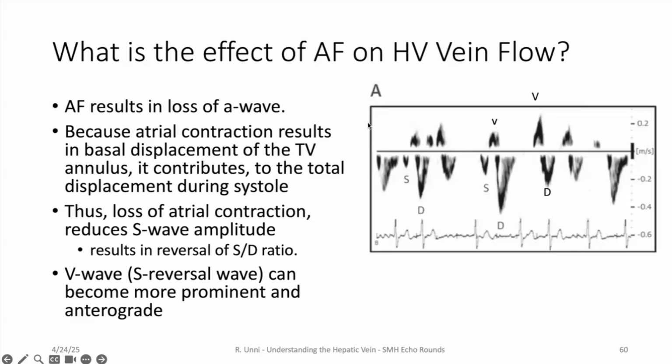And so you may look at this and say, oh, does this count as systolic reversal? It's a reversal that's happening right after the QRS. Well, this is different than that systolic reversal wave created by TR, but you should just note that when you have patients in AFib, you might see a bit more of these transient or transitional V waves.